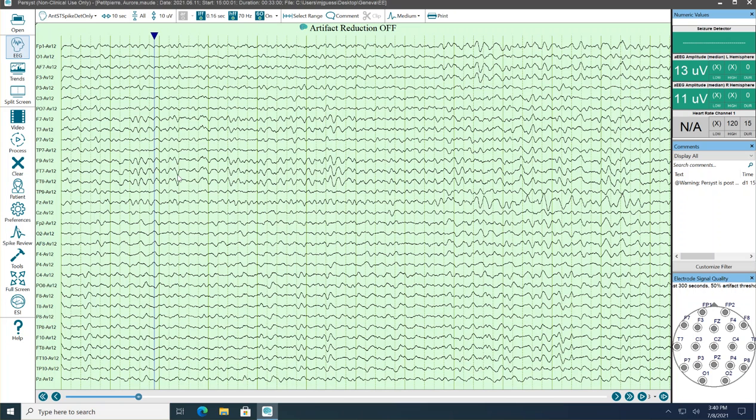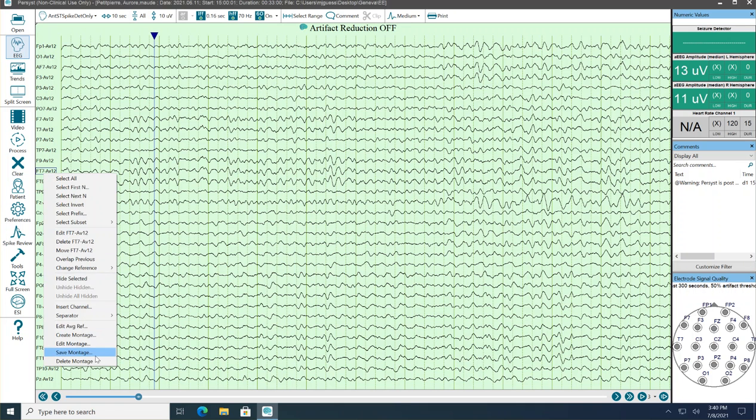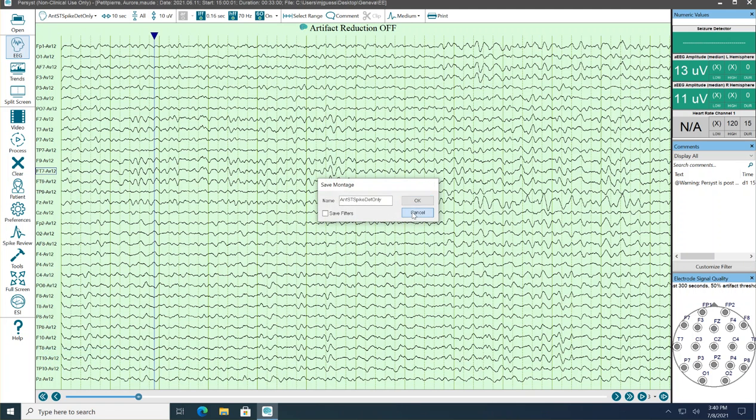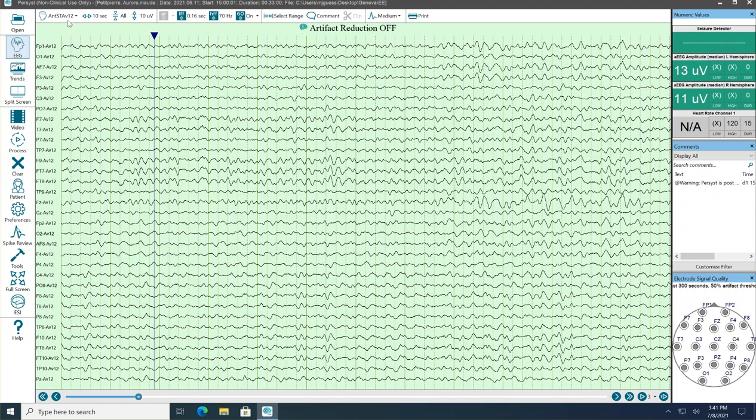So it's not my favorites. Why? Well, I don't want to change this montage inadvertently for review. A lot of times you want to add, let's say, an EKG channel. Well, we don't want to add that to spike detection because that's a lot of spike detections in an EKG channel if we tell it to scan that, right? So instead of doing that, I just saved it as. If I right click, save montage, and give it a different name, well, what did I do? It's the same montage, but it's just called ANT-ST for subtemporal average 12.